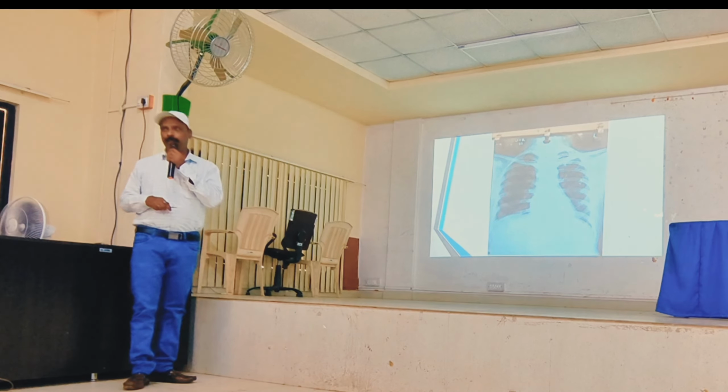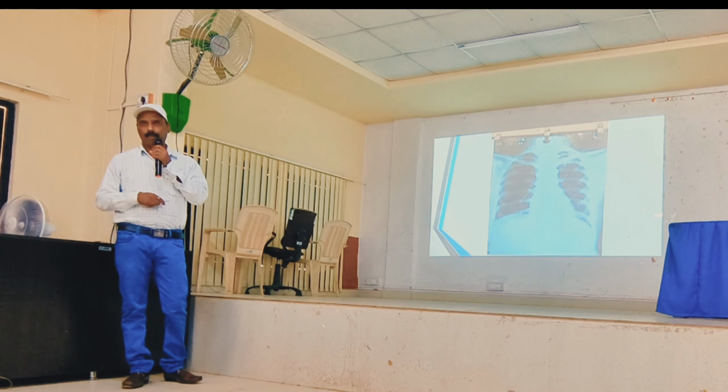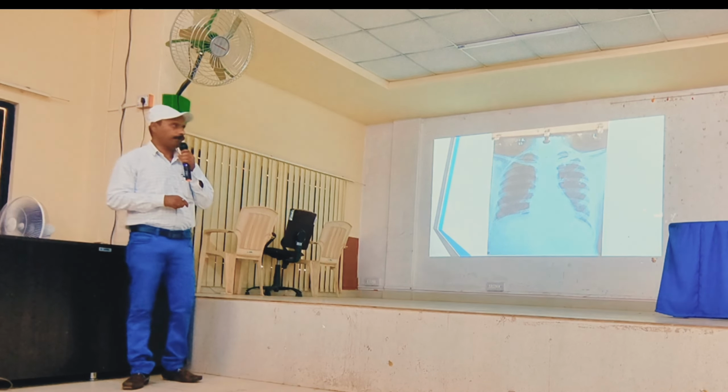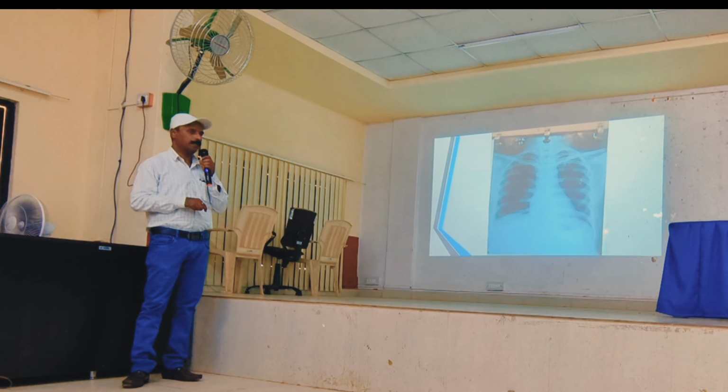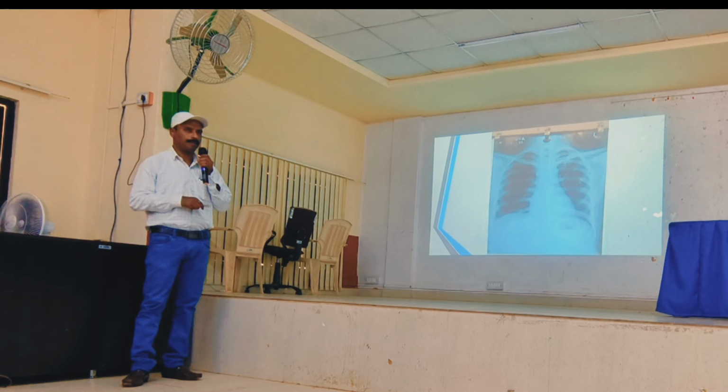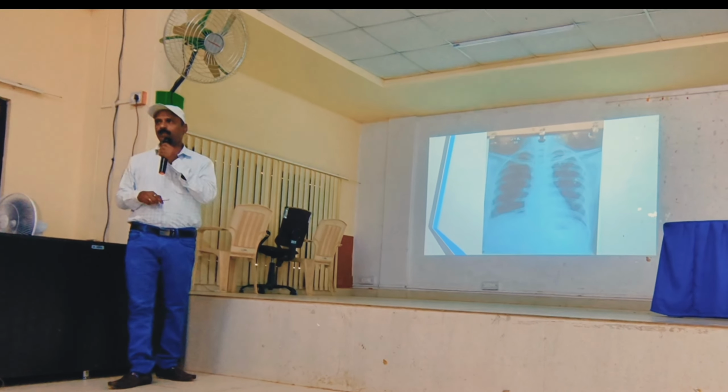It is my department view box X-ray I have taken. Usually we keep for the spotting and all, and that is a V sheet. Here you can see the dome of the diaphragm, gas in the fundus. So this is a normal PA chest.